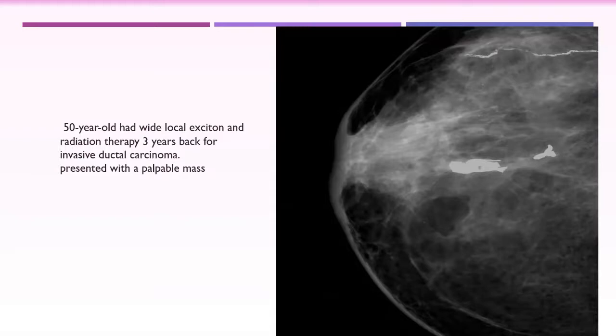In addition, if there are any changes in the calcification, like what? The disruption. Excellent, well done. If the calcifications are forming a large single opacity, or one unit, like here, we have two calcifications, but each is more or less a large homogeneous opacity.